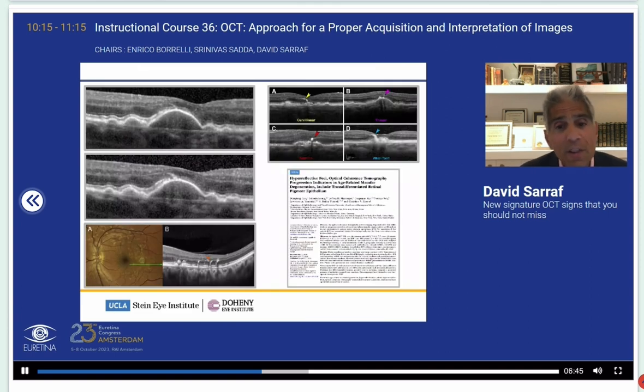And plume is another example of material, in this case RPE, tracking in the Henle fiber layer, as in retinal dystrophies and in AMD, it can be very common, and it's the result of disruption of the RPE because this is actual material tracking in the Henle fiber layer and it's not an actual pathoanatomical disturbance of the Henle fiber layer itself, we've chosen to term these lesions differently.